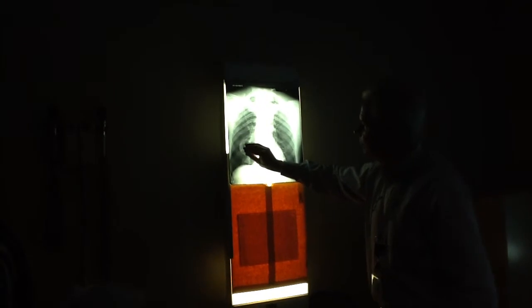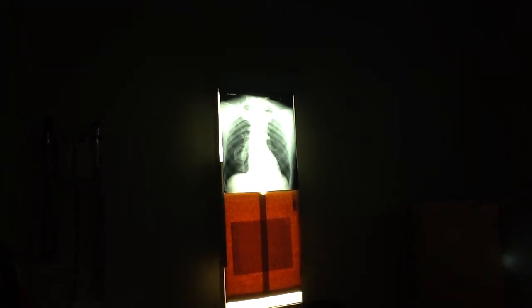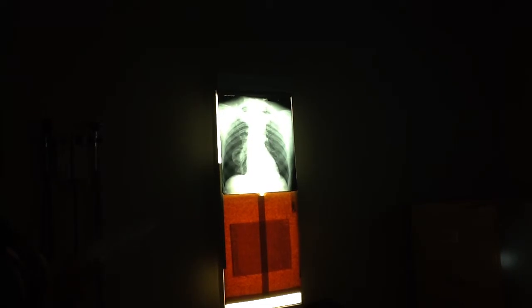If we made it homogeneous, though, the thing's almost the size of a tennis ball, isn't it? And is well-defined. That's very characteristic for tumor, to have that kind of appearance. Circular, oval, well-defined is classic for tumor.